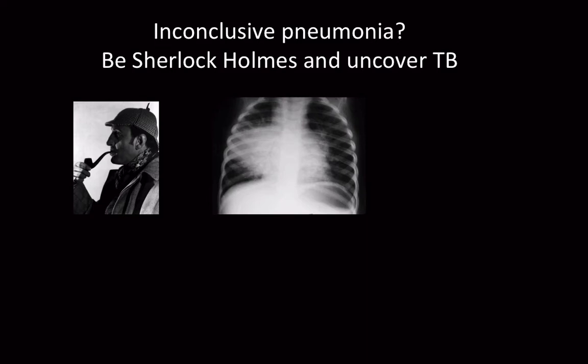You can see there's all sorts of parenchymal disease going on, pneumonia. And it's quite difficult to see lymphadenopathy at the hilum because there is no hilum to be seen. If you look through the density, you might see the bronchus compressed over there.